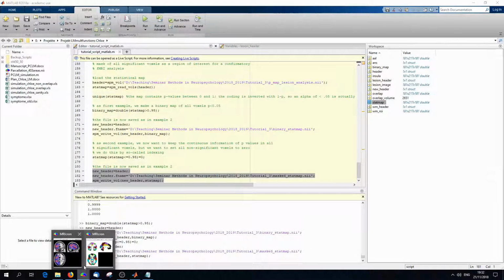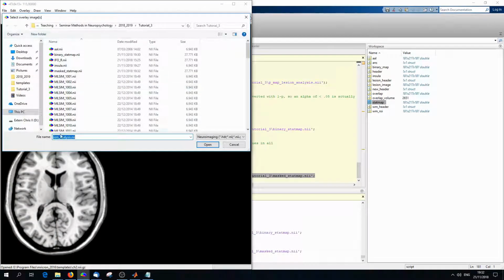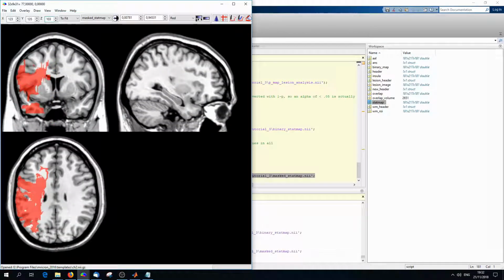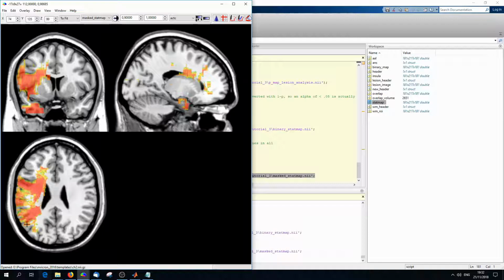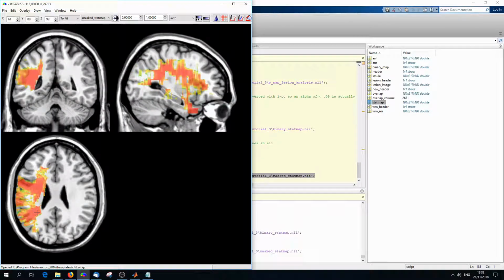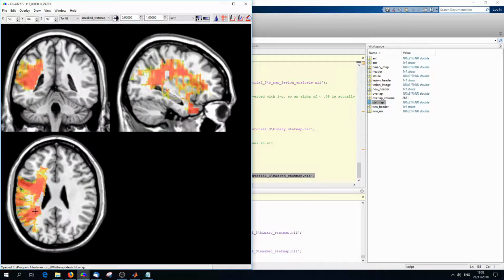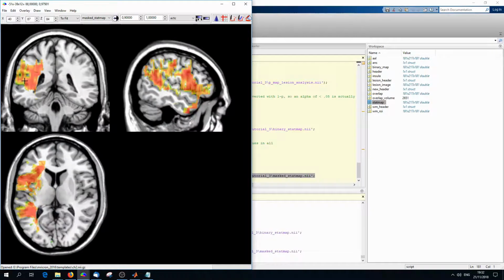And we can again look up the image. I close the old overlays, open the new one, and I called it mask stat map. And if we now rescale this image, for example, to ACTC scale, you see now there are different values in this map. There are still values like 0.99, like 1, but often something like 0.99, 0.98. So the continuous information inside this area was kept.